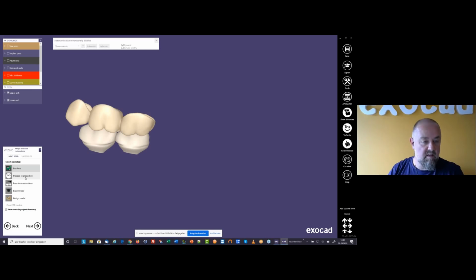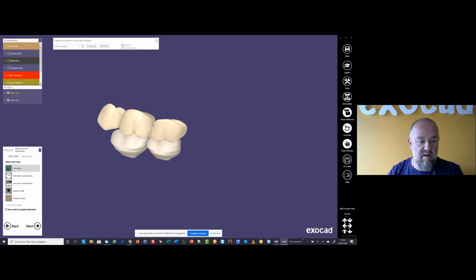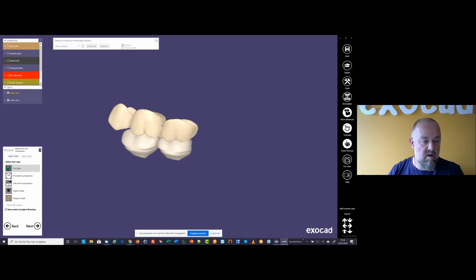Then you just enter the lot number, material, position and nesting. All is already done, and the toolpath calculation will start directly. This might take some time. Then you click next and your machine will start running. As we are not able to show that now, if you still have 5 minutes, I'd like to show you another option you have now.